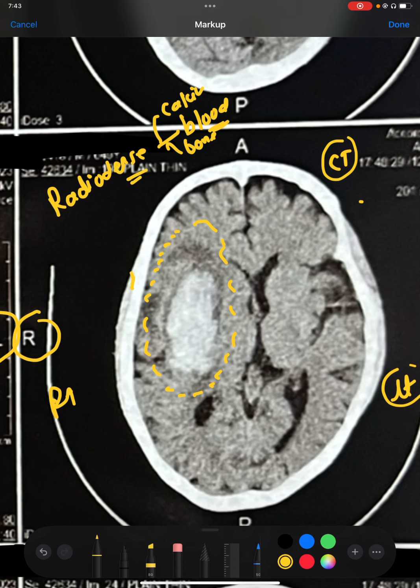So we know that this is skull. This all is skull, so it is appearing dense white or radio dense. And as white as this is this structure, which is blood. Obviously, we have defined stroke as a sudden onset neurological deficit which is attributable to a vascular cause, and the patient presents with sudden onset of weakness of something.